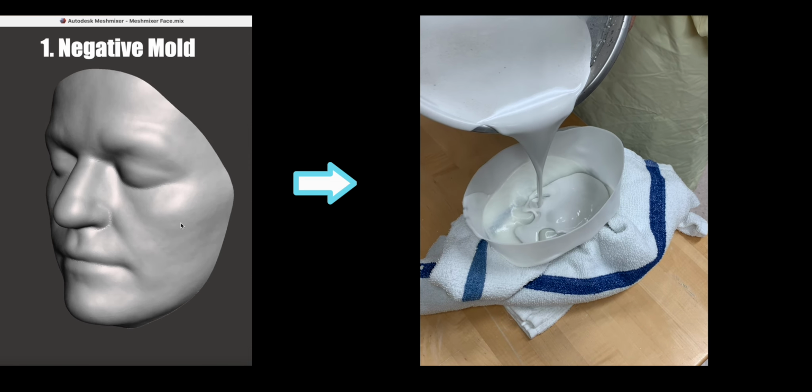Now, if I show the wireframe, you can see that the triangles in this mesh are fairly irregular. I find things behave better down the road when they're more uniform. So here I'm going to select all and remesh. The result looks bad because I used a really low resolution model. So I'll try again, but this time I'll use the slider to increase the triangle density. You don't have to increase the density if your model is already pretty detailed. You can see now, looking at the wireframe, there's a higher triangle count and they're more uniform.